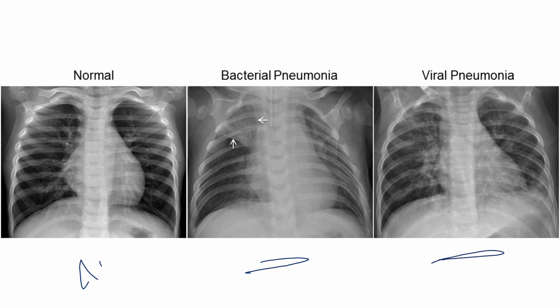And here you'll see the bacterial pneumonia is more of a solid cloud than these fingers. I don't know why I call them fingers, right? So you see all these streaks, like spiderweb streaks or fingers is what I kind of call them. So those are more common in your viral pneumonias. That streakiness is also common in cardiogenic pulmonary edema and non-cardiogenic pulmonary edema. So with pulmonary edema, you'll see those streaks, but it's because of blood vessels being enlarged. But what you're looking at here is that viral pneumonia where it just has those fingers or those streaks that are going sort of all over the place.